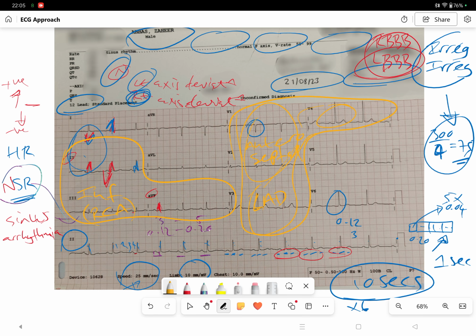That then leaves us finally with the last part of the heart, and this again is this bit here and this bit over here. This is the lateral aspect of the ECG, as you can see, and that also is part of the lateral aspect of the ECG. We don't really look at this lead over here, and we don't really look at this lead over here.